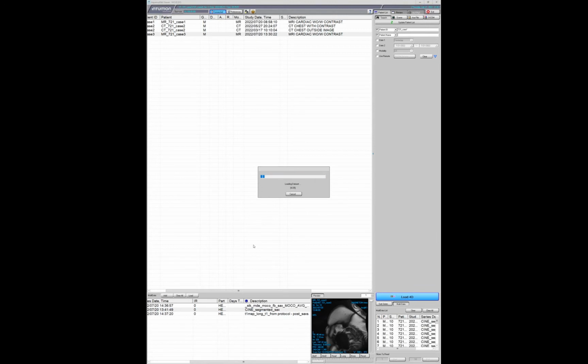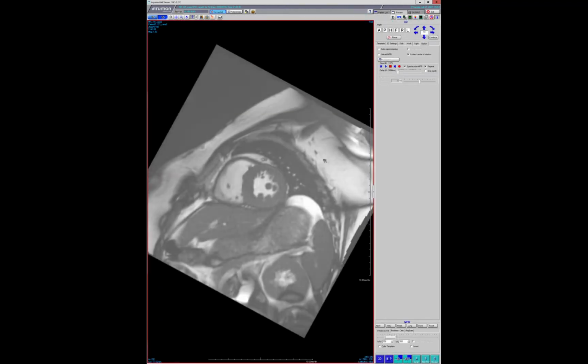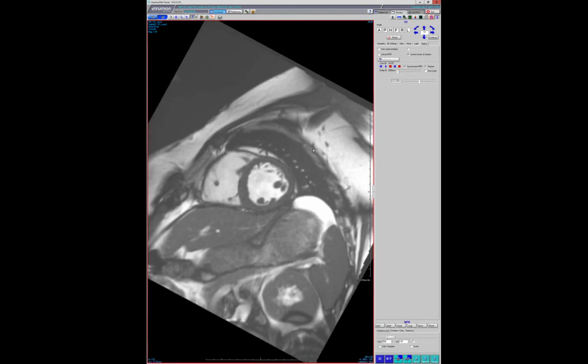This is only interesting because I've shown cases of this in the past, where it's dramatically positive for Fabry's disease. Still not sure if it's Fabry's or Fabry's. But this LV looks kind of normal.